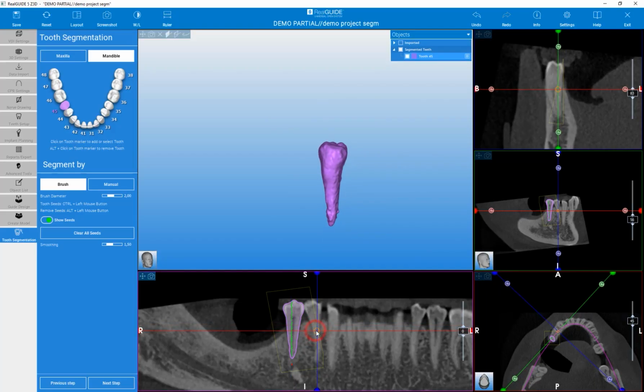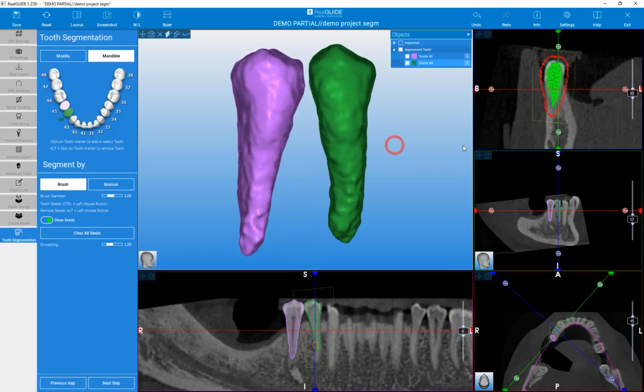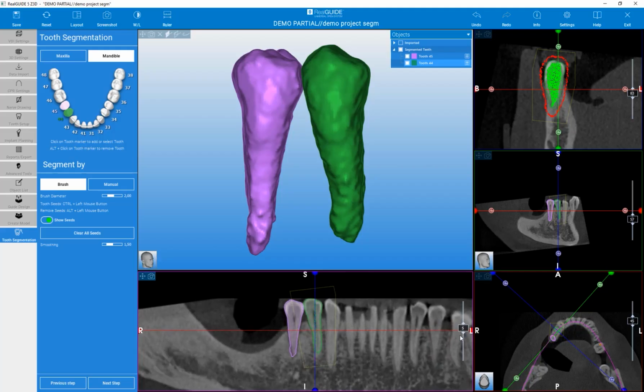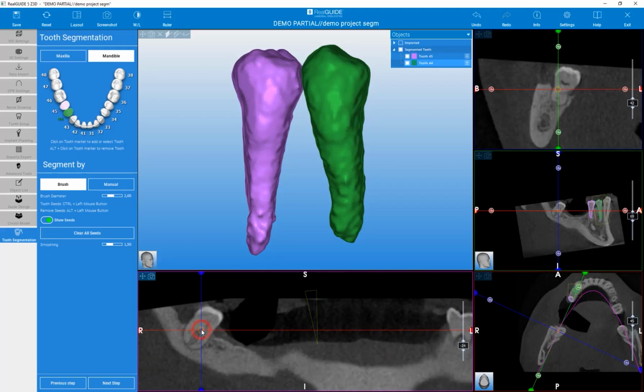This segmentation is extracted from your dataset. We can do the same for additional teeth as well. Center your views and then outline your identified tooth. This tool is ideally used when you want to see a tooth relationship in the 3D to a planned implant, but it can also be used to improve the aesthetics of your project.